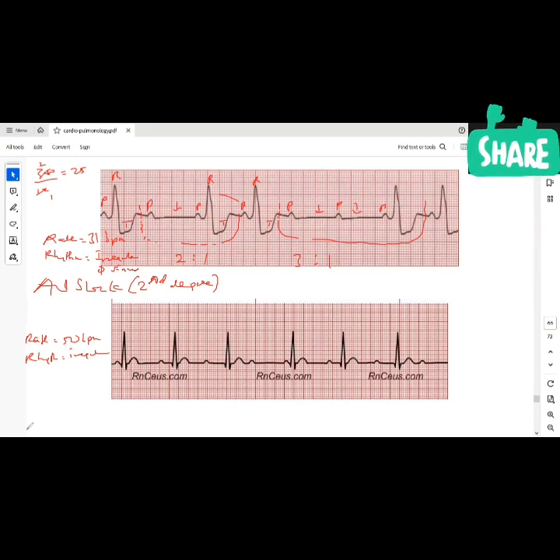It's not sinus, because there's some absent QRS complexes. Okay, where? After the third QRS complex. Thank you very much. So this is a P, there is no QRS here. And I have a P under here, very good. So this is not a sinus reading. Now tell me, what will you be thinking when you see that some P waves or a P wave doesn't have a QRS complex? You're thinking some kind of AV block.